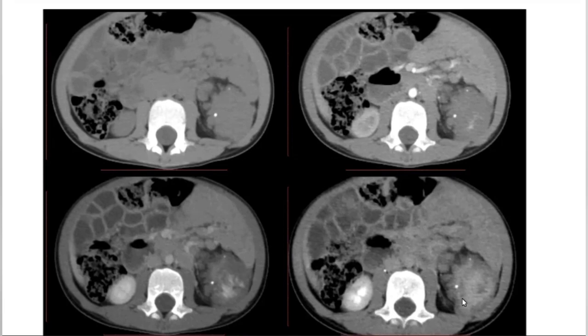So it's a bit of a difficult film. I can understand at your level, of course. I just wanted to show you that some of the films are very difficult, in the sense that sometimes you're not really tuned to look at these lesions in some other areas.